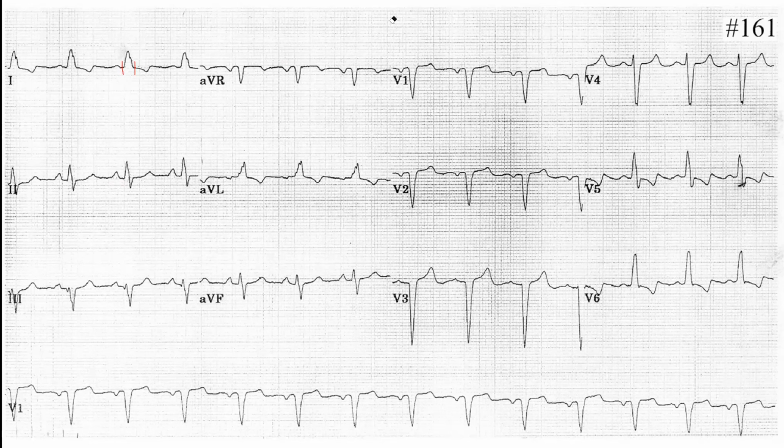So the impulse is generated by the sinus and that impulse goes down to the ventricle. If the QRS is wide, you do have a problem with the ventricle activation. It takes longer, but every impulse that came from the supraventricular area got to the ventricle. So the conduction abnormality should be inside the ventricle. So you have a bundle branch block. Which type, right or left? This is what you have to decide.